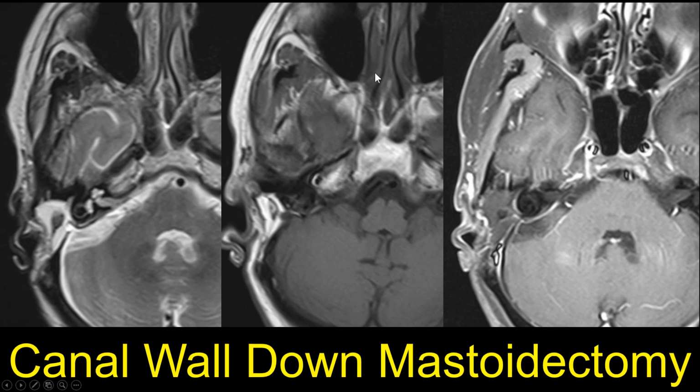Here the nose is dark, so that's pre-contrasted. Here the nose is bright, so this is a post-contrasted image. So if the nose is dark, that's before contrast, a pre-contrasted MR. And the nose itself, the nasal mucosa and the turbinates, take up contrast very quickly. So the nose, if it's bright, that's a post-contrasted image. So we see with fat saturation how we've suppressed out that fat that's in the fat packing of this mastoidectomy bed. And we find the external auditory canal and see if that has been resected or not.